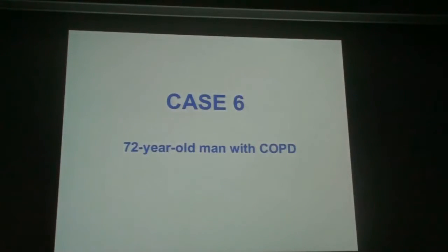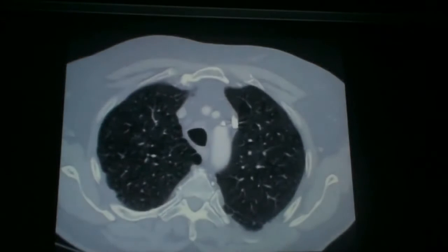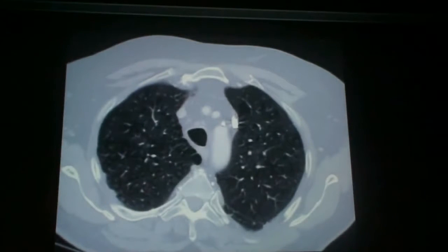So case number 6 concerns a 72-year-old man with COPD. And he has no special symptoms except symptoms referred to his COPD status. And this is the CT scan.